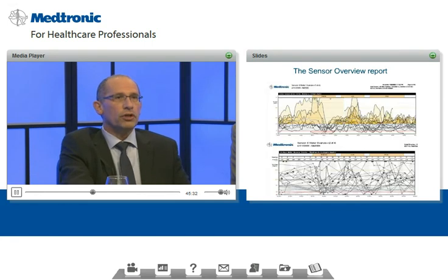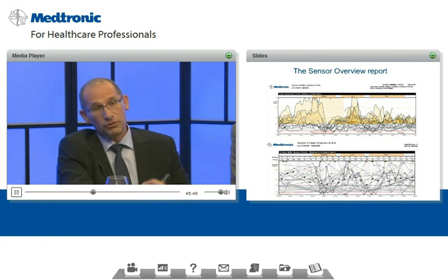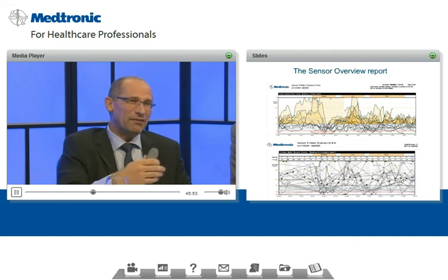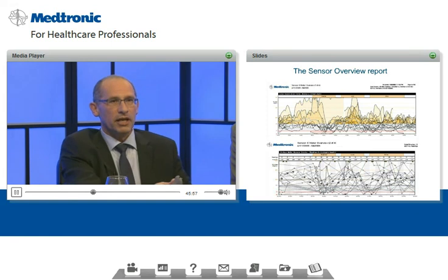Again, when you look at the overview of blood glucose measured with SMBG versus the CGM, you can see that the same patient at the same time, while using non-continuous sensing, looks very difficult to understand. Using continuous glucose sensing can give you more insight into pattern recognition, pattern problems, and better pinpoint the issues at hand.